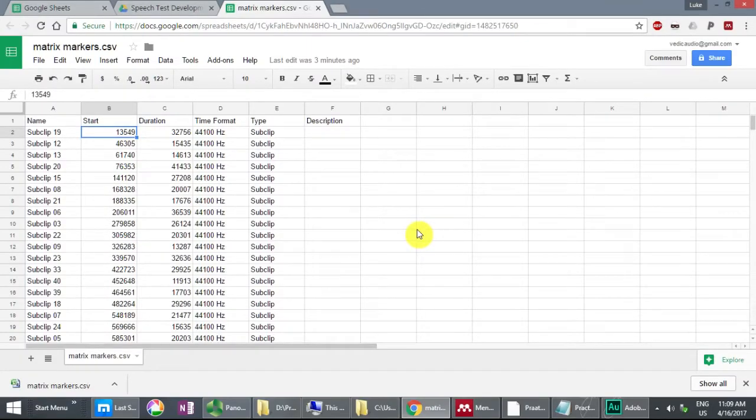So we need to subtract 17.5 milliseconds from the start time. And then because now we've moved that start time back, we need to add 35 milliseconds to the duration. But we have these expressed as samples. So this is where it comes in handy to do a little bit of sampling rate math. So if we have our sampling rate over here, 44,100, then we have 35 milliseconds and we have 17.5 milliseconds.